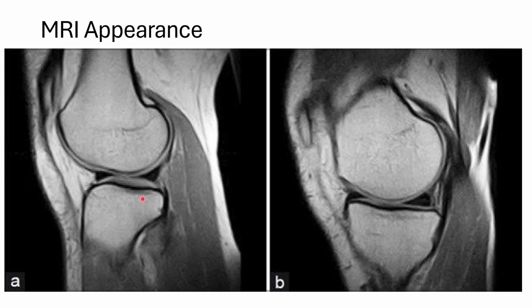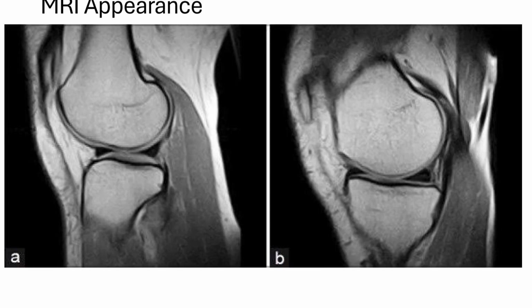On MRI, menisci appear uniformly low signal intensity on all sequences. Their morphology is sharp and triangular. We can see here it has a triangular morphology. In this image also we can see this has the triangular morphology. Smooth articular surfaces, no abnormal signal reaching the articular surface. So remember, an intrameniscal signal that does not reach the articular surface is degeneration, not necessarily a tear. So high signal intensity not reaching the articular surface is not a tear, it is a degeneration.